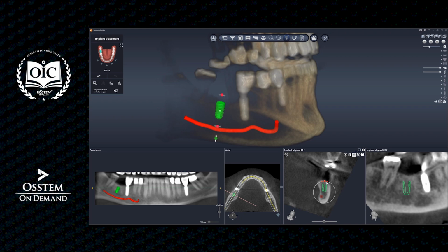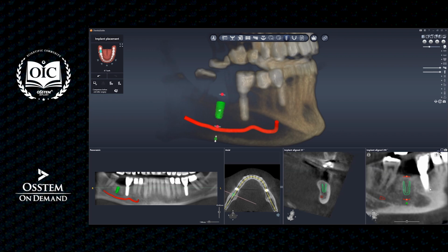So that's another short video. We don't plan implant like that, or we shouldn't plan implant like that, because we can have a big mistake. If we have only implant library, we can make a wrong position.